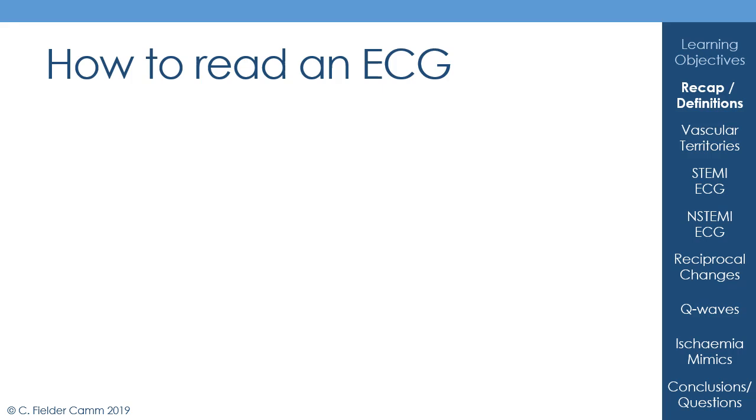So before we get into the real meat of the lecture today, and this is something that we'll be doing for every lecture moving forward, we're just going to recap how to read the ECG. If you need more detail, then I'd suggest going back to lecture 1 and revisiting it, but here we're just going to take a very quick whistle stop around the interpretation of the ECG.